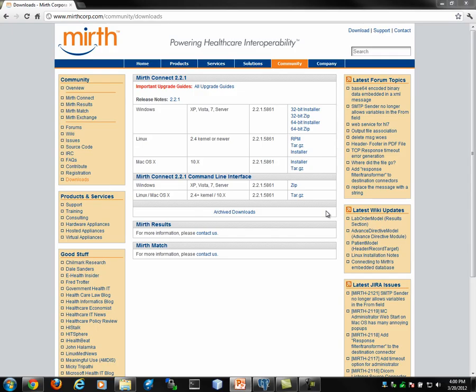First, you'll need to download the correct version of Mirth Connect. I'm running this screencast on Windows, so I'm going to pick one of the Windows installers. I could also download the zip if I just wanted to extract it and run it from the zip, but in this case I'll download the 64-bit installer.